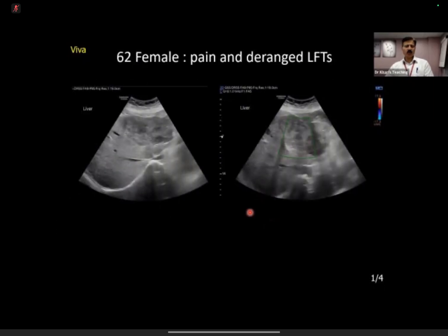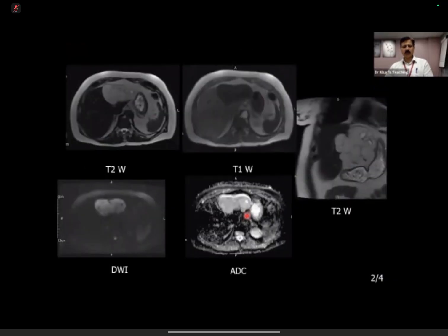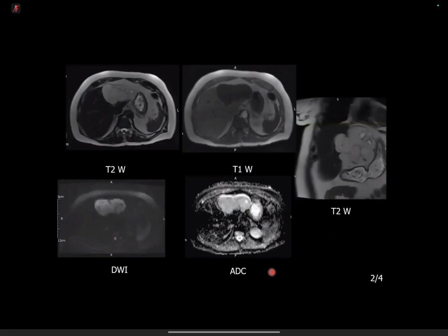This is a case in which, this is an ultrasound exam, 62-year-old, this was the lesion. So we did MR, and you just comment on these sequences and then I'll show you contrast. Over to you. Okay, so I've got MR series, axial slices. The lesion is hypo-intense on T1, hyper-intense on T2, hyper-intense both on ADC and DWI, which would indicate T2 shine-through rather than genuine diffusion restriction.